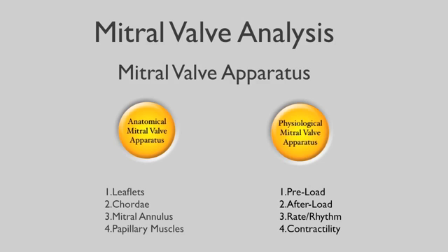This discussion will focus on the basic assessment of the mitral valve. We will cover anatomic two-dimensional assessment and color flow assessment of mitral regurgitation and stenosis. In considering the mitral valve, equal attention must be paid to the structure and physiologic environment.